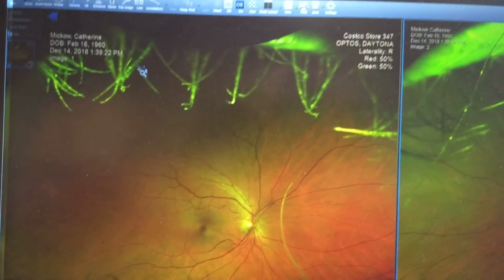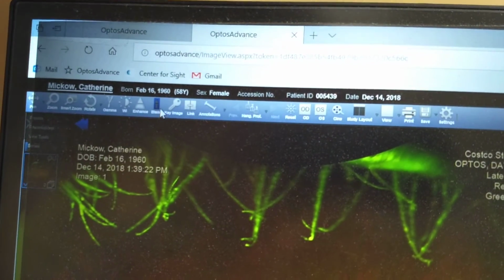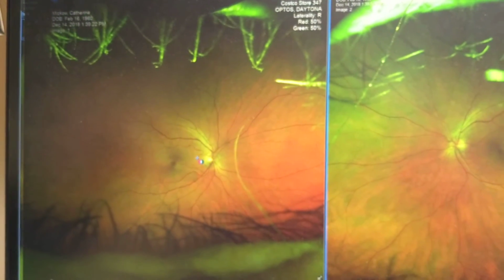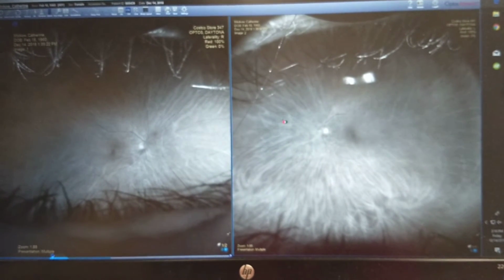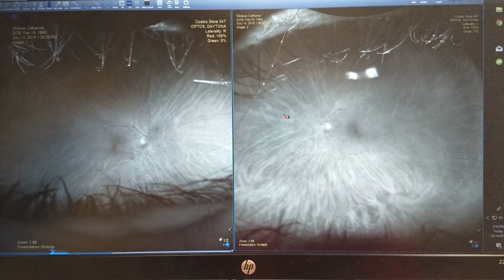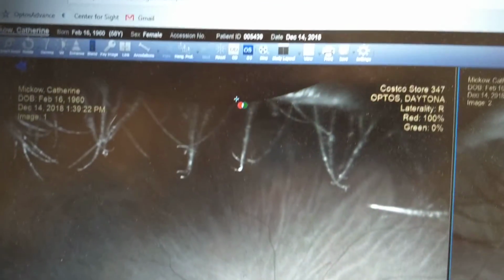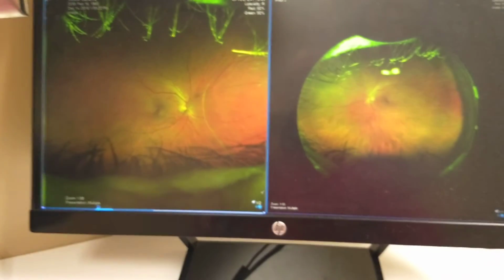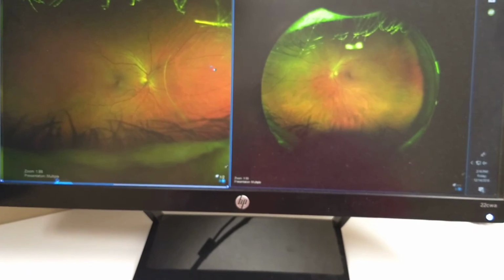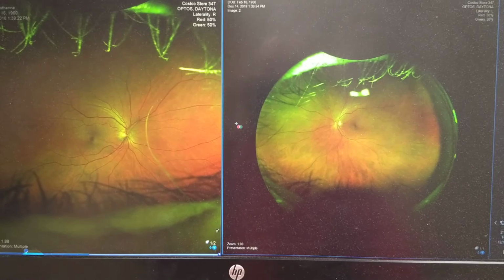Then to go back to look at the choroid level, we come here, click the red-green icon. This time we hold the left button and push up, and we get the choroid level there. And then to go back to normal, we click on the reset to go back to the way it was to begin with. And then lastly, for the 3D, that doesn't do any kind of animation anymore.